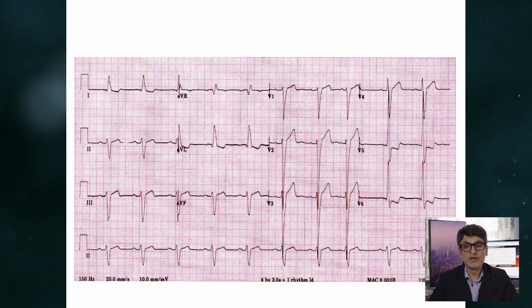This is an ECG of someone with hypertension who has come for their annual assessment. They have the ECG taken, and we look at it. So we know the indication, we know the demographics. Let's say they're 60 years old. And what we see is that the rate is certainly they're not tachycardic. We don't have an automated readout, but looking at it, that looks about between 60 and 70 beats a minute. The rhythm is regular.